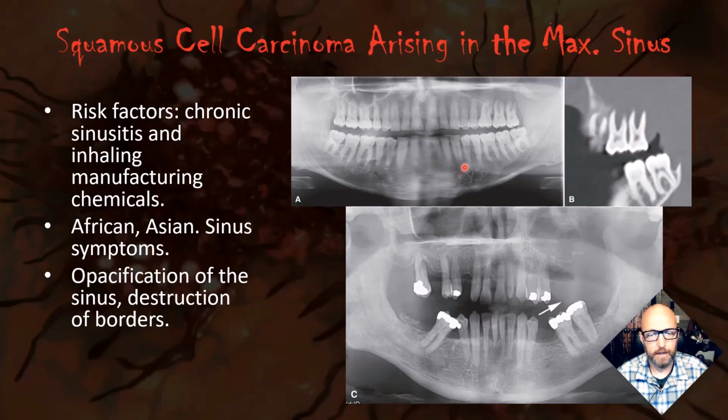It just goes to show that was a case that really shows how necessary it is to thoroughly investigate all your radiographs, and especially in cone beam CT where you have that 3D view, where you see so many more structures than you do even in pano. Although I pointed out all the different anatomical structures that are very clear in a panoramic radiograph, cone beam CT has probably 10 times the number of structures. You're looking now at the skull base. The floor of the skull has so many foramina, all the way back into the nasal cavity, all the paranasal sinuses, not just the floor and posterior border of the maxillary sinus. But there's so much more responsibility that comes with 3D imaging.